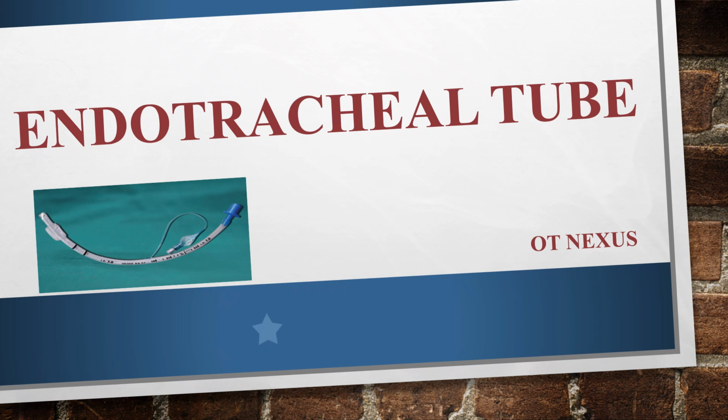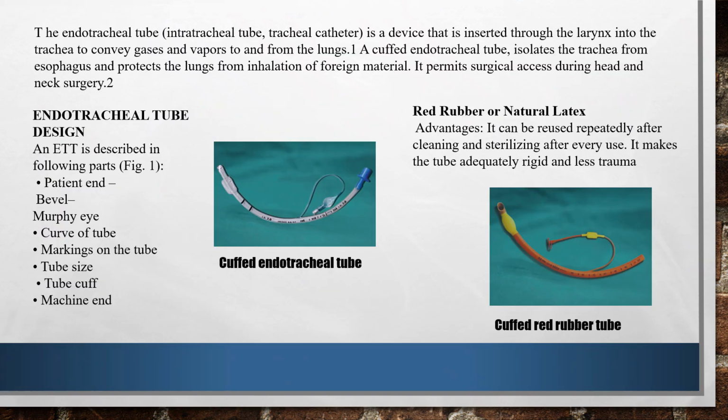Today our topic will be the endotracheal tube. The endotracheal tube, or intratracheal tube, or we can say a tracheal catheter, is a kind of device that we use to intubate the patient, and the procedure itself is called intubation.